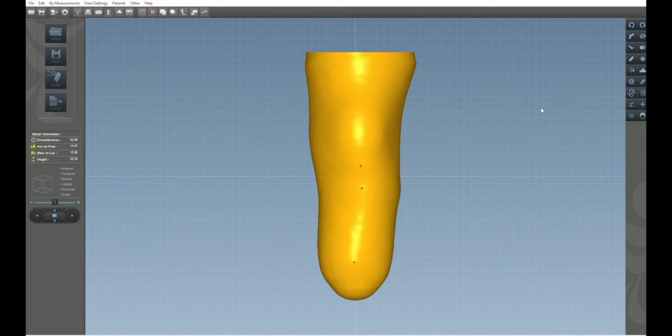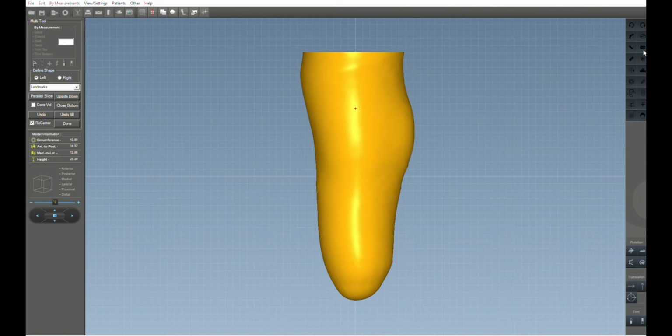So I'm going to quickly jump now into the modification process. Now, keep in mind that my focus in modifying is to be able to do a quantifiable, repeatable process. In other words, I don't want to just do it by feel, a little bit of fudging, a little bit of rubbing, a little bit of cutting, a little bit of adding, and saying there's my finished model. I want to do a quantified amount. I want to do what I normally do and what I know repeatedly gives me good results. So as I go, keep that in mind, it helps to explain why I'm going through each step.